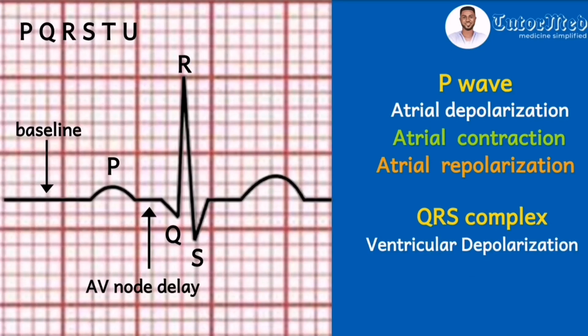We will explain why for the ventricles the ECG gave us a complex, but for the atria the ECG gave us a wave. But follow closely. The atrial repolarization, which is its deactivation, occurs at the time of ventricular depolarization. But where is that event on the ECG? The ECG did not record it. Why? Because the ECG is a paparazzi. It only takes note of big events, and so to the ECG, ventricular depolarization is more important than a small atria deactivating, and so it will record the bigger events.